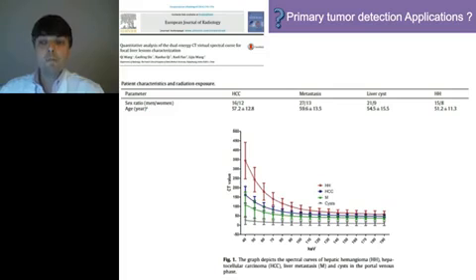Third question, can we go maybe further with clinical application? Actually, if we can decompose the tissue composition of a tumor based on different energy levels, we can distinguish different attenuation profiles of different tumors. That's a recent paper on the behavior of different tumors across different energy levels, showing that the attenuation levels of hepatic hemangioma show different attenuation curves to that of HCC, to that of metastasis, and to that of cysts. So basically, we could maybe distinguish different tumors based on the attenuation profiles.